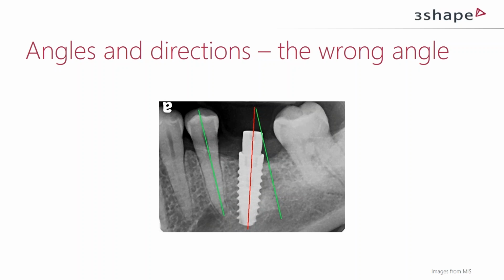But you are, as the director and manager of Implant Studio, of course well trained in the software and you know everything. But now when seeing this, it could actually be a nice tool to aim for, to place the implant in the same angles as the original teeth if we have them. Oh, absolutely.